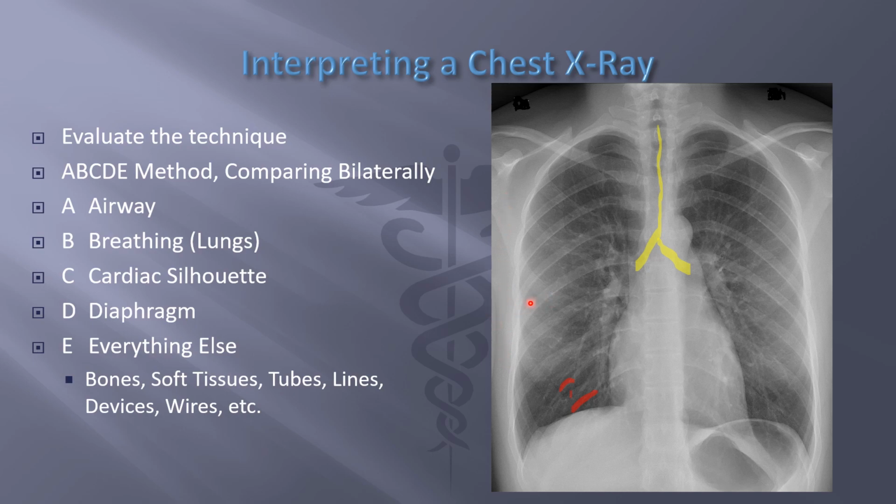If they have a collapsed lung and air is leaking out into the subcutaneous tissue here, we'll see what's called subcutaneous emphysema. And we can compare it to both sides. Typically, when you have subcutaneous air, it's not bilateral. It will just be one side. So you always want to compare both sides. And also, I'm looking for any wires or tubes or any devices such as a pacemaker here, and I don't see any of that. So you want to look for hardware as well.